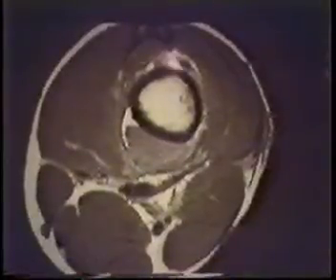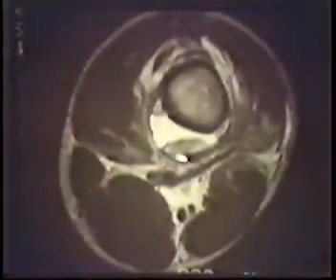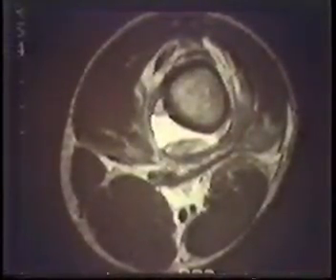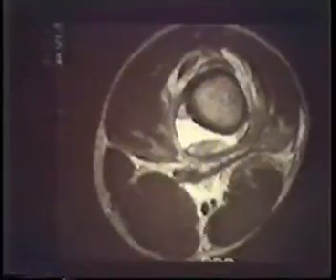This is the patient's MR scan. Notice this looks like it may be a muscle, but that's not muscle. Kind of high signal in here. This is a young patient. The patient grew staph out of the bloodstream, and when a needle was stuck into this, you got pus out, frank pus. On the axial scans, this is the pus collection here and here, which is contained by the periosteum on the T2-weighted image. So this is a frank case of osteomyelitis with virtually normal plain films and a bone scan.